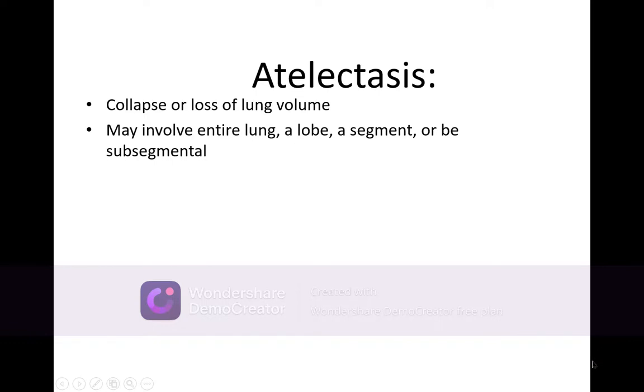It means a collapse of the lung volume. There is parenchyma, and the supply is to the bronchi, and the alveolar spaces and alveolar membranes are the ultimate source of oxygenation here. So it is a collapse of the lung volume, that is, the parenchymal or alveolar spaces.